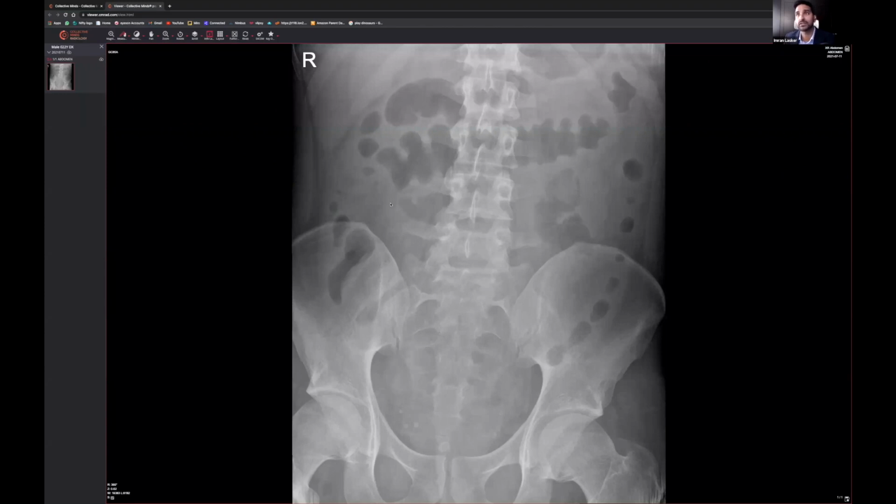So if the bowel is fluid filled and obstructed, you may not be able to see that. So that's why whenever I report these, I'd say something like there is no air-filled bowel obstruction. When you look at this particular one, you can see that the large bowel is going to be on the outside, and somewhere in the middle of all there is going to be the small bowel, just generally speaking.